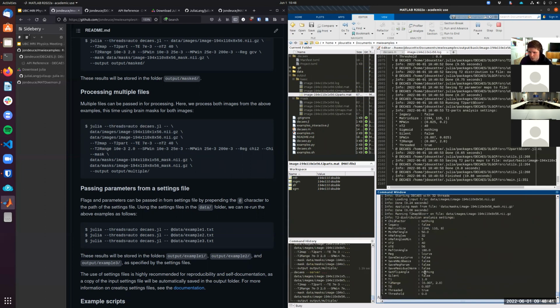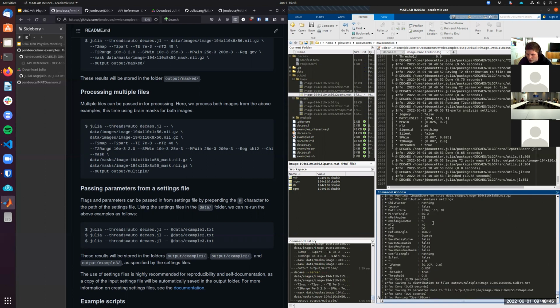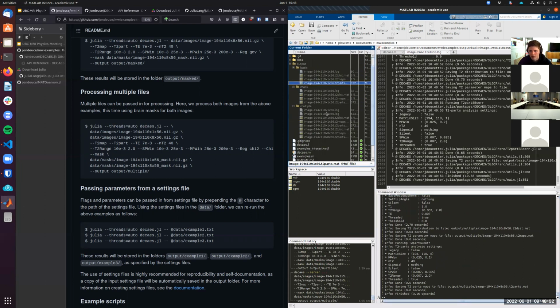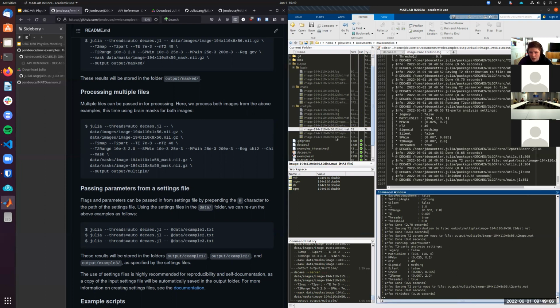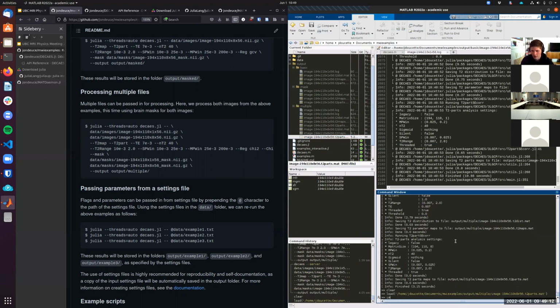Okay, there we go. So the first one ran super quickly. It just flew by. I don't even know where that ended, in like a second or so. And the second one took about 3 seconds. So now those are in this folder. So now you see it stores the results for all the files with the image name prepended, and then the .t2dist will be the distribution for this first file, and the t2dist distribution for the second file.